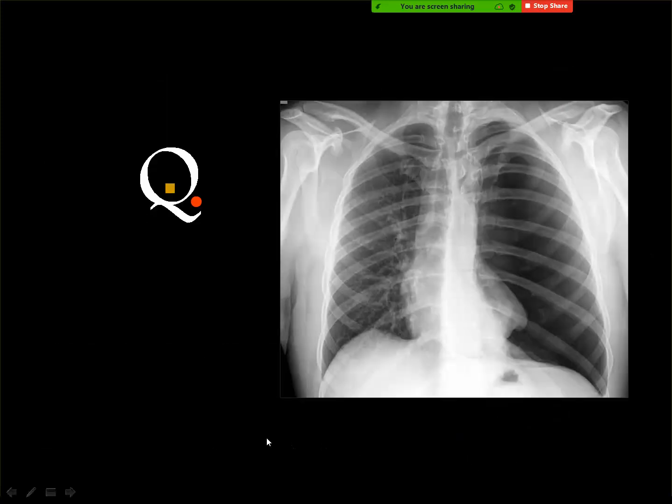Yes. Left-sided pneumothorax. Tension pneumothorax. Tension. I don't think that this is tension, because you know that the left copula is lower than the right copula, and this is usual. And the heart is almost in the central part of the mediastinum. Okay.